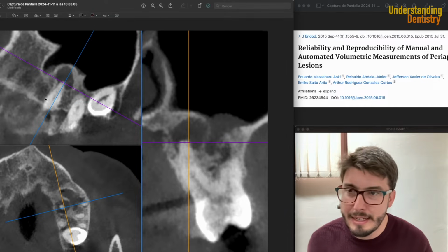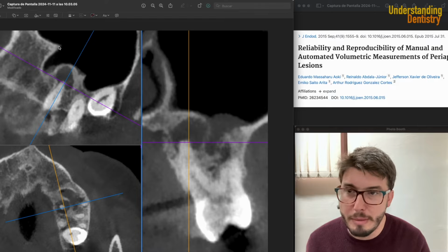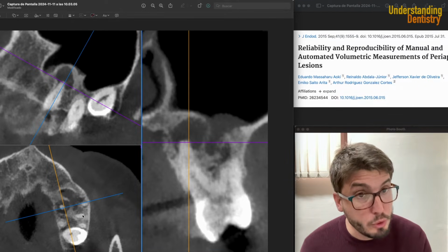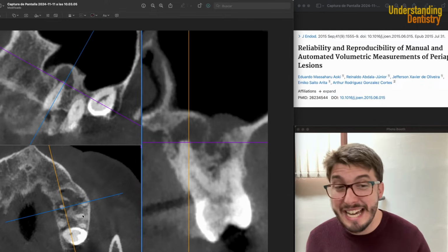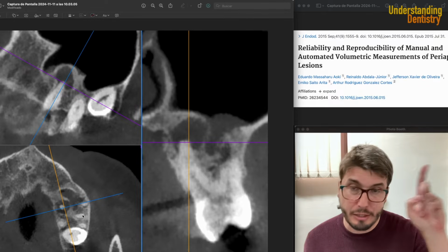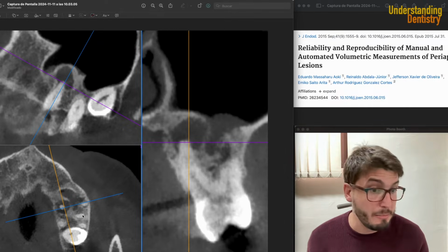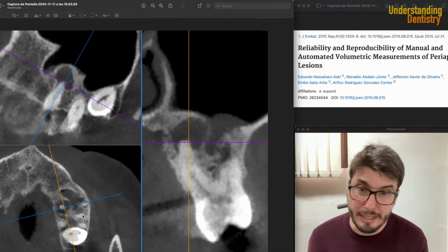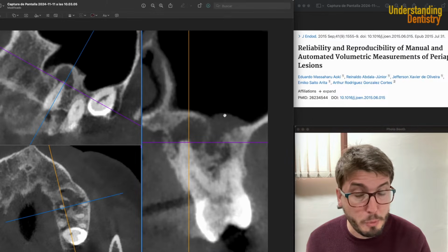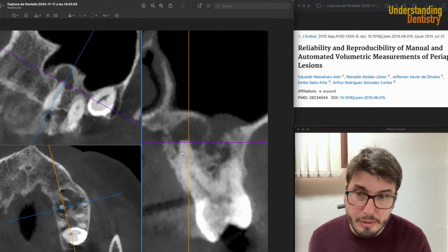And then we are seeing the lesion centralized on the axis of all the planes, like we should do to diagnose. If you guys don't remember how to do that with CBCT using any DICOM software, any DICOM viewer, please refer to this link on the top right corner of this screen that I'm going to add, which is the video on how to read CBCT from our YouTube channel, all right? Now, there is even this opacification of the maxillary sinus due to the lesion, to the radicular cyst.